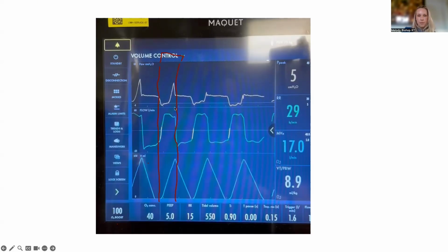So the tremendous amount of work this patient is doing is, instead of a peak airway pressure of like 25, for a lot of this breath, it's either 0 or -4. And it probably only goes up to this number here because the patient is tired or just lets go of that pull. And then it just rebounds back to this number. And then we go into expiration and the cycle begins over again. Even in these two, right here, this is like -4. It's unbelievable the amount of inspiratory pressure that the patient's generating to make the waveform look like that. It's just crazy stuff.